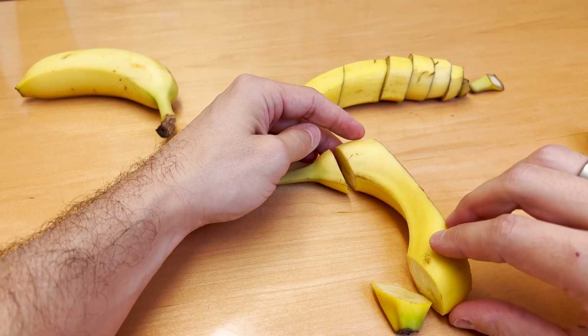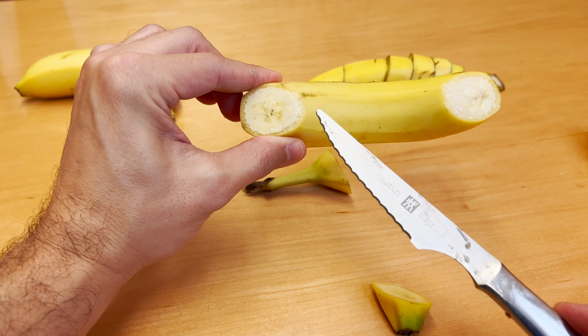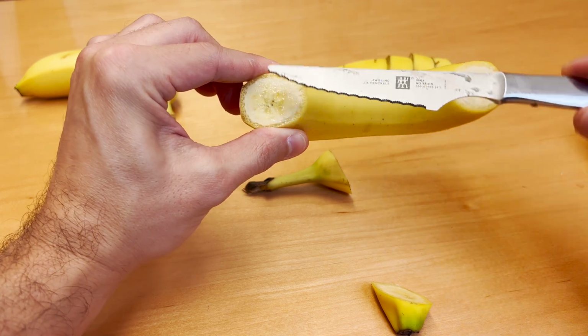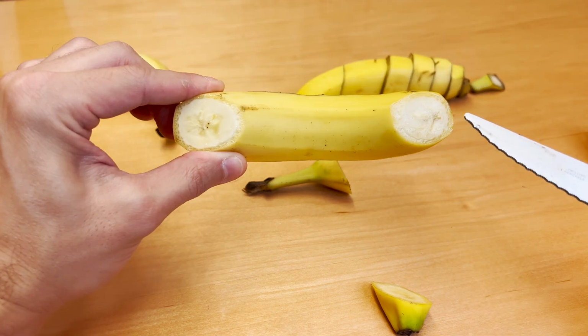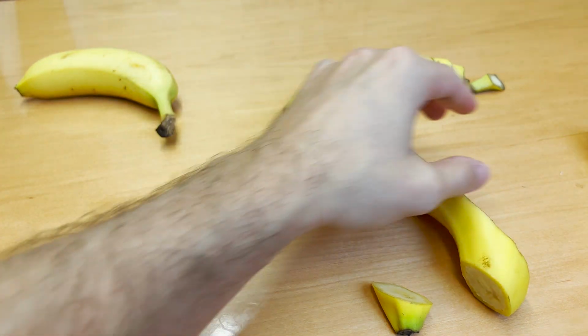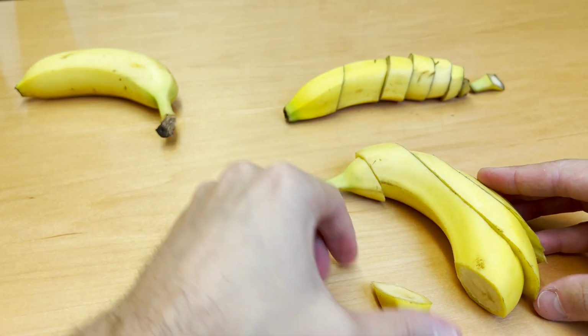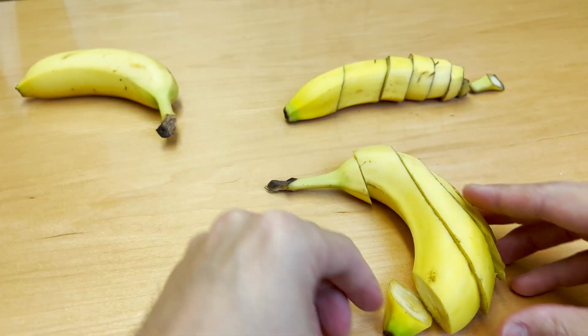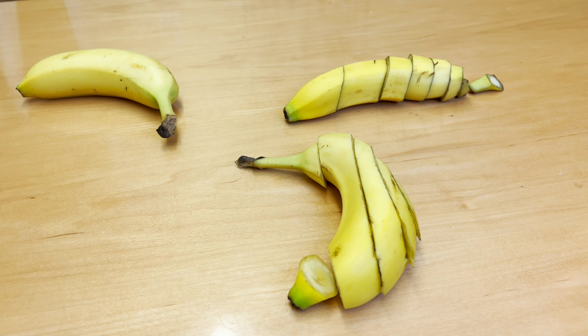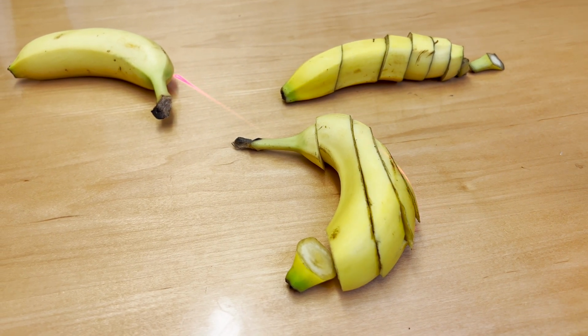So if we hold our cross section here, actually on the image, we won't see this. We'll actually see just this part of the banana and this part of the banana as the image moves through. So to demonstrate that, that's how we're looking on the banana. So our cuts are moving through it just like this.